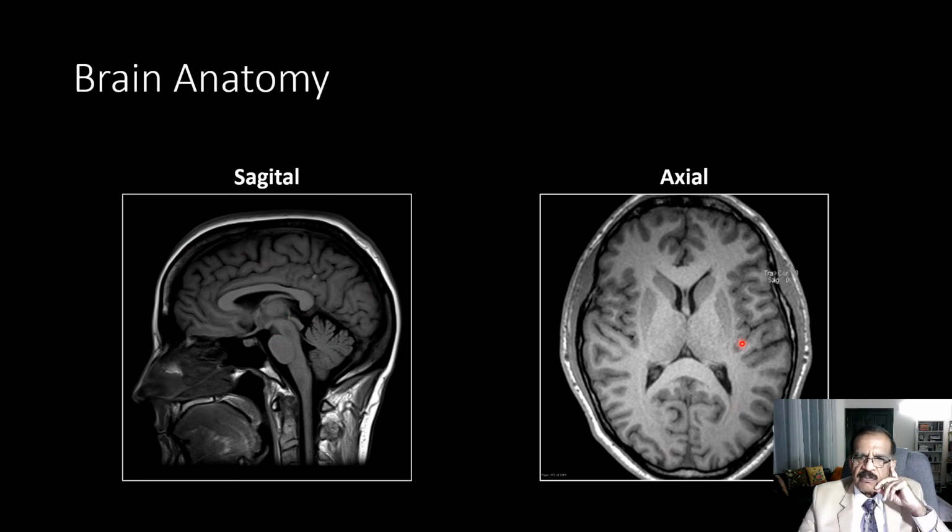On this, you again appreciate the sulci and gyri, and you can actually tell the white matter. You can differentiate white matter from the gray matter. See, these are gyri. Outer side is the gray matter, inside is white matter. These are frontal lobes, these are parietal lobes, then this is occipital lobe. You can see the caudate nuclei. This one is caudate nucleus.